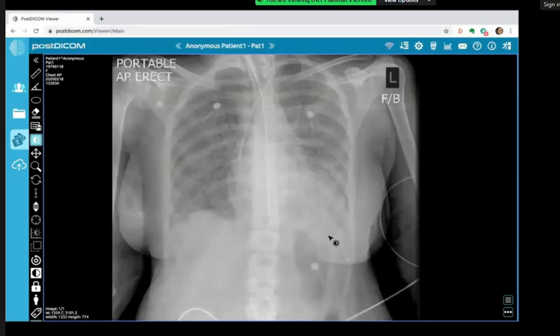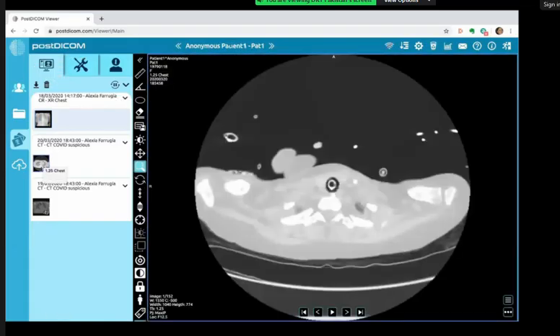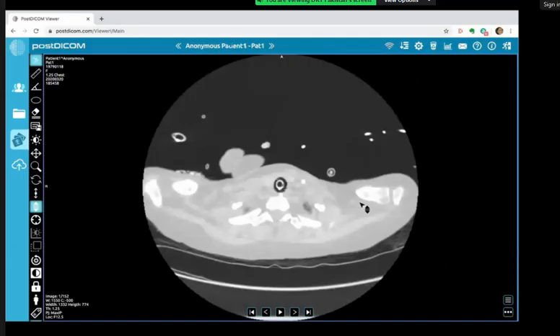So with the history, I will be thinking along the lines of an infectious process, given the transplant history. I would like to know about the immune status of the patient, if there is evidence of immunosuppression. Yes, she is heavily immunosuppressed. So with that history, my first differential would be a PCP, which is known as PJP now in the current context, and I will do a CT to evaluate the pattern further. Well done. Let's have a look.